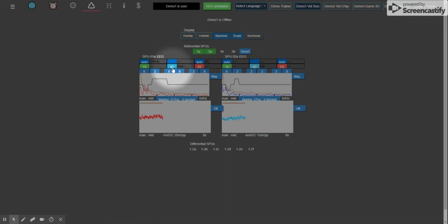Analog control signals. The one that sits in the middle, which is proportionally between reward and inhibit, is nominally at a value of 50. It can go to 0 for an inhibit. It can go to 100 for a reward. These are rewards only, and they again vary from 0 to 100. The higher the number, the stronger the reward. And in here, the higher the number, the stronger the inhibit.